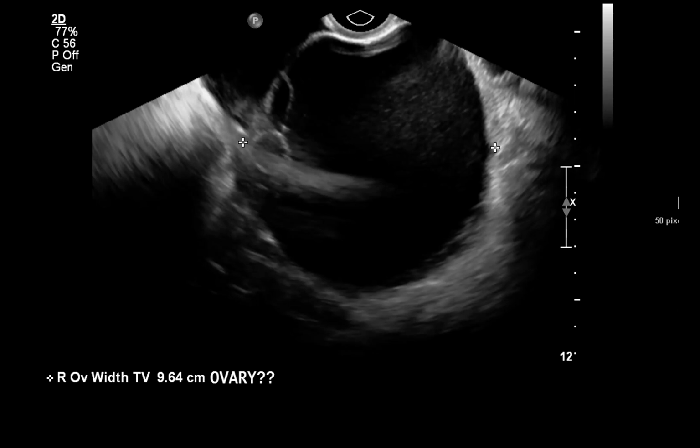She came for a CT for other reasons, and we found this big mass. Then she underwent surgery and it was removed. Apparently she didn't have many symptoms except mass symptoms, because it was so large. I'm trying to find it. Probably slowly growing over time. If I find it, I will share that with you.